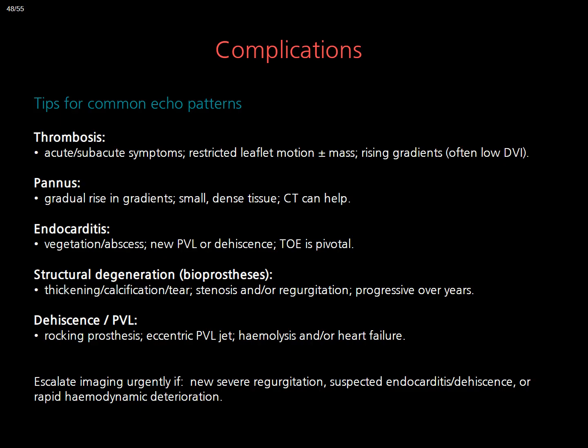And if you see rocking or an eccentric PVL jet, consider dehiscence and escalate urgently if there is new severe regurgitation or hemodynamic deterioration.